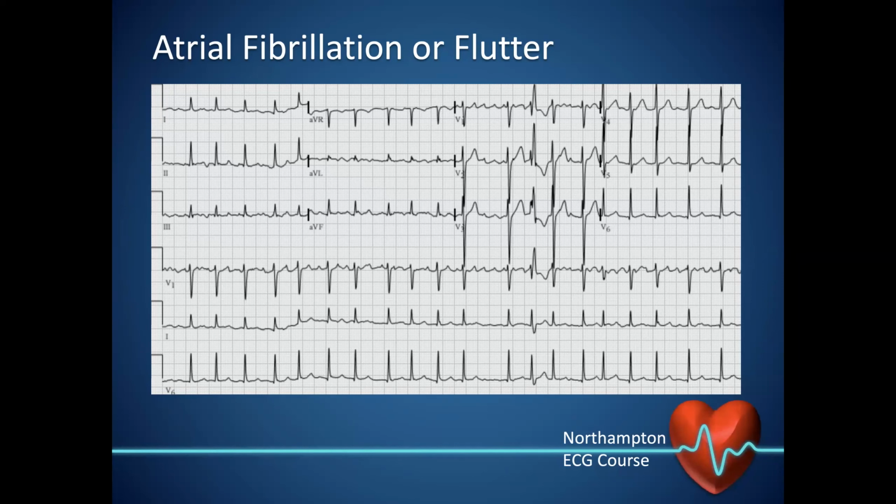Yeah, so AFib with an isolated ventricular ectopic, and when you've got that right bundle branch block in V1, that's typical of, I think, AFib. I think it's to do with the conduction in the right bundle branch and the left bundle branch. I'm trying to think about the name for it.